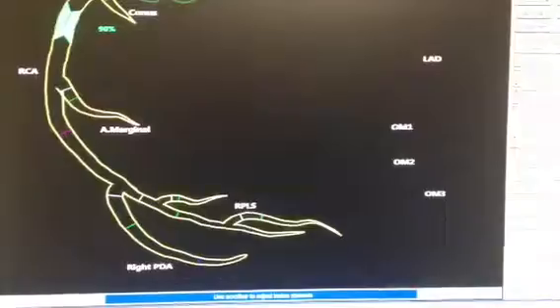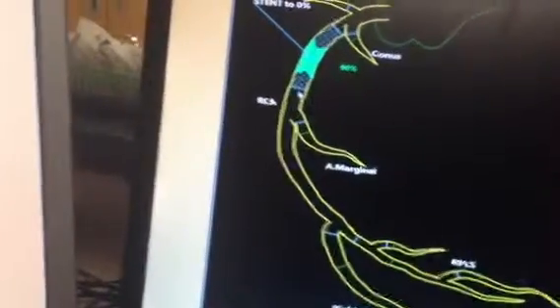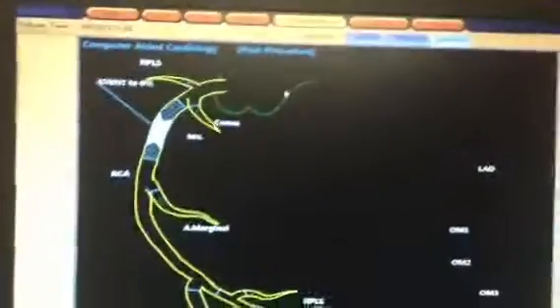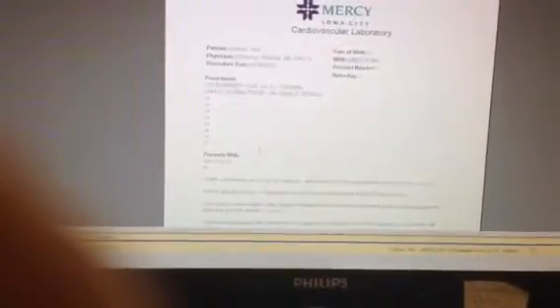And then she can put her stent in. And that'll show just Dr. Lee's image. And then I like to put over here post-procedure so it's clear. And this is the post-procedure image. Now when she goes to transcription, this is just on the regular control computer, because it actually works faster. There will be a template that comes up automatically. Don't use this one. This is the default template that will have the regular language.